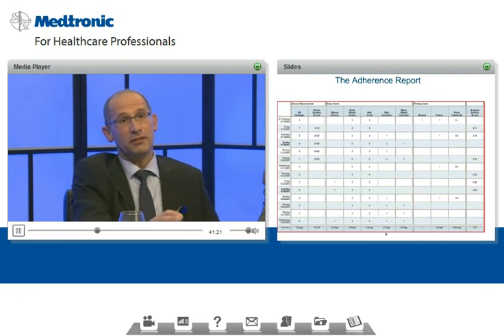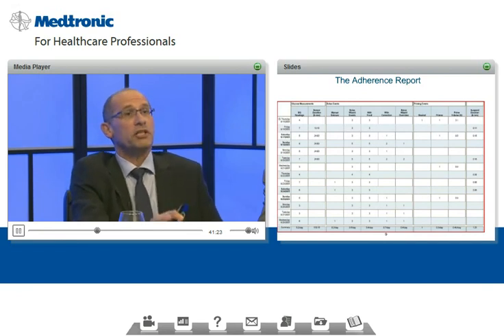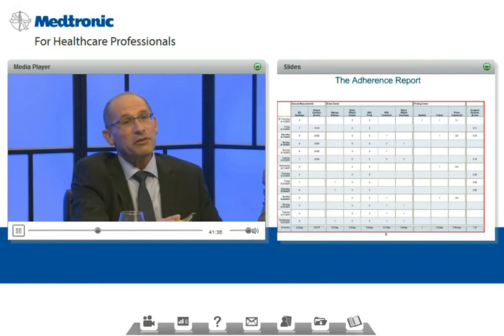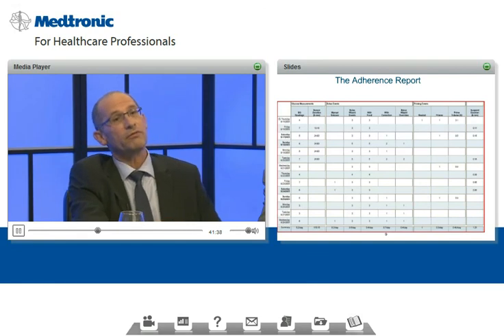Because if the patient has many boluses which need a correction done, that means that he starts the bolus when the blood glucose is out of range. If he has many blood glucose boluses when he's out of range, that means there is a hint that maybe the basal is off, that something is wrong with the plan.